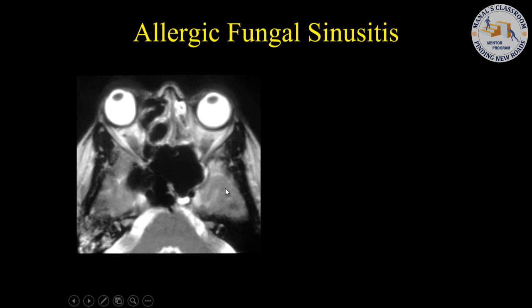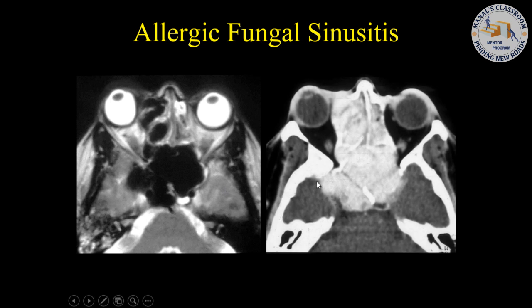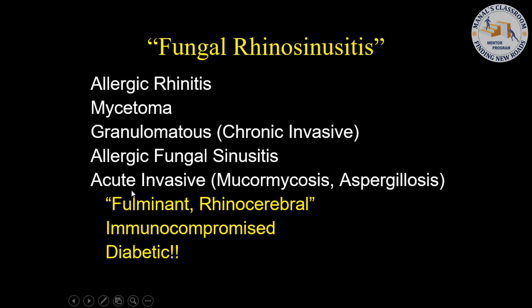And this is just an example here of the allergic fungal sinusitis, and it looks like this is normal, right? Think it's normal? Same patient. Yeah. And the reason all that signal loss is there is because of the heavy metals in the protein. So a couple points here. You may not see it on MR. And also on MR, I'm very reluctant to go ahead and call the sinuses and comment on the aeration because of all the dephasing artifact.